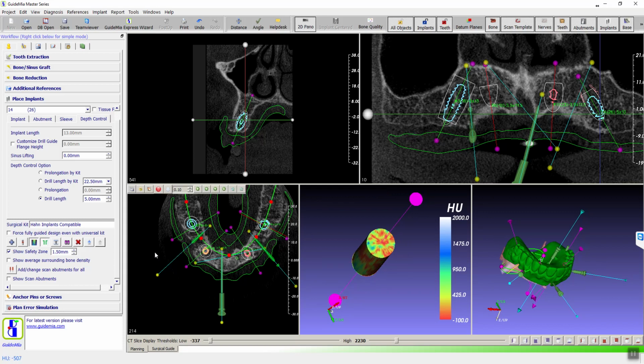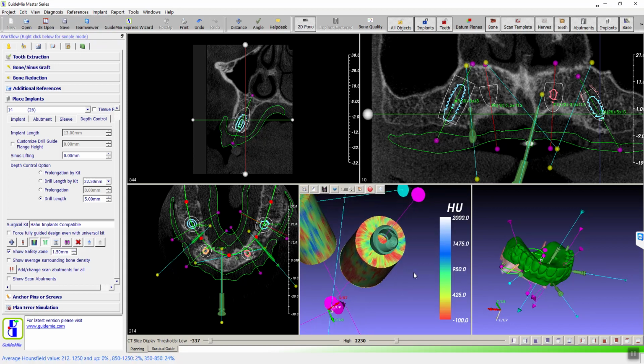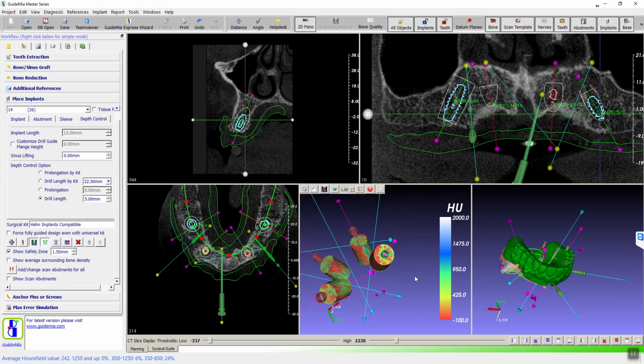And Brian, we haven't showed you this, but we actually have another one under diagnosis. We have this neighborhood viewer. What it does is show you the surrounding for all the implants. So when my mouse is in this view, it's dynamically changing this one. So you can investigate this.